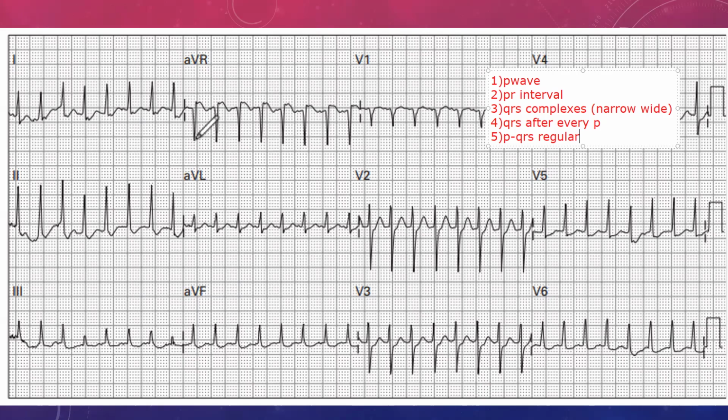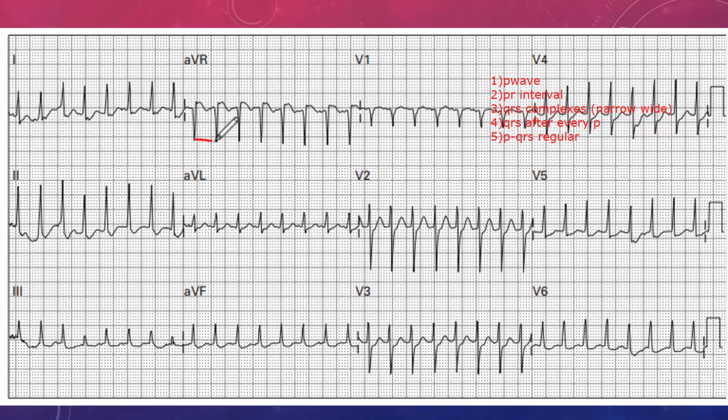If you look at that, there's basically almost no difference between, for example, that R and R, and this R and R, and this R and R. And let me ask you, is that normal or abnormal to have absolutely no difference? If I'm counting it out here, they're almost exactly the same. 1, 2, 3, 4, 5, 6, 7. We go here, 1, 2, 3, 4, 5, 6, 7. And I know people get shy, so that's why I'm saying you can even put it in the chat. Do you think that's normal to have absolutely no difference from one contraction to the next?